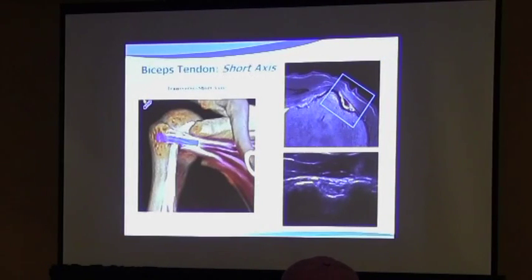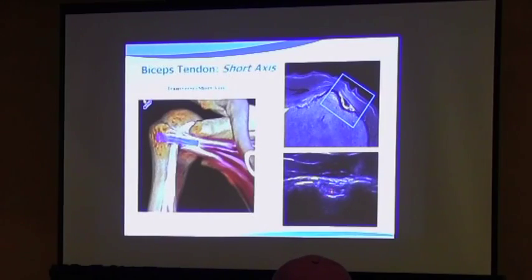Notice that the biceps tendon on MR is dark, and you don't see those individual tendon fibers that you do see on ultrasound, because those tendon fibers brighten up, they reflect sound. So this demonstrates that spatial resolution improvement that you get with ultrasound imaging over MR.